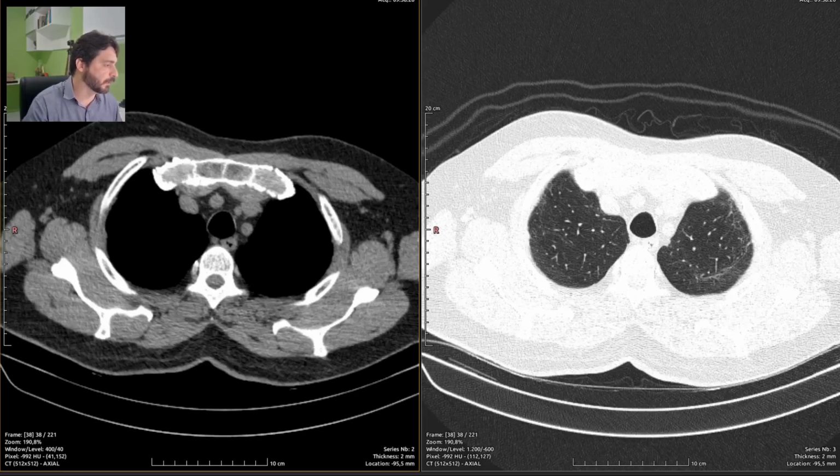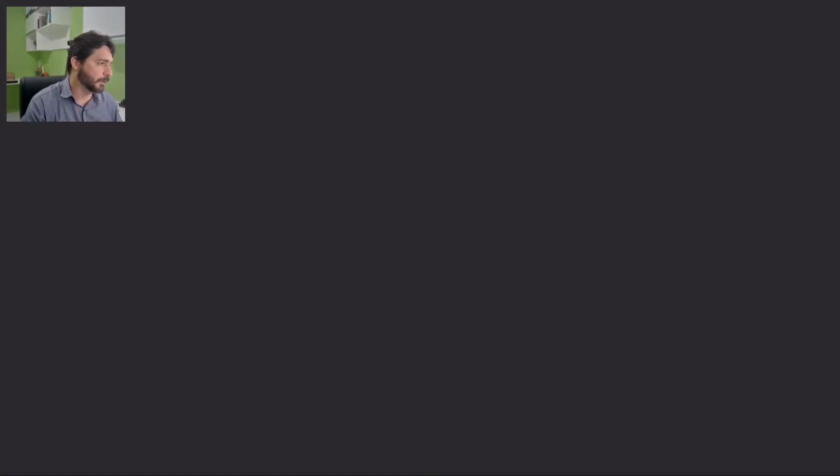Now I'm typing, and this is it for today. This is it for this case. Let's sign it. Let's clear these images and go for the next one.